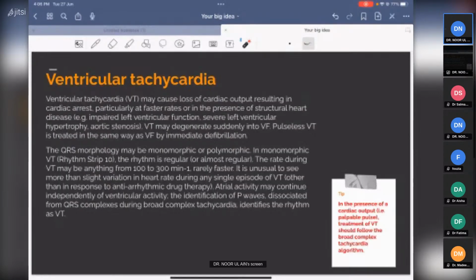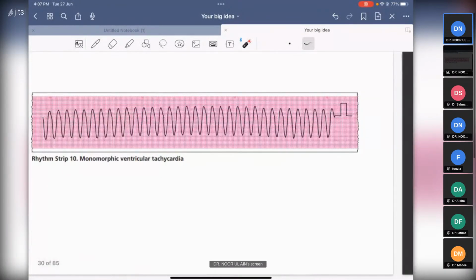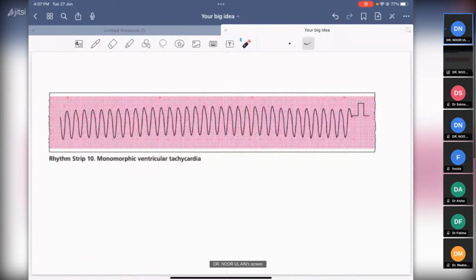Okay. Great. See, this is a ventricular tachycardia. Let's ask yourself those 6 questions. Do you see electrical activity? Yes. What is a heart rate? Of course, there is a tachycardia. तो देख के पता चला. You don't even have to count the boxes. पता चल रहा है, right? That it's a tachycardia. Third question क्या था? QRS क्या? First, electrical activity है या नहीं है? Second question was what is the heart rate? Third question was, guys, talk.